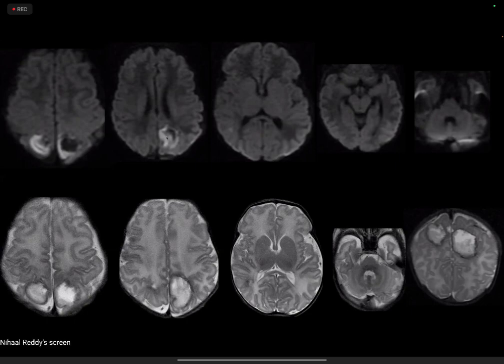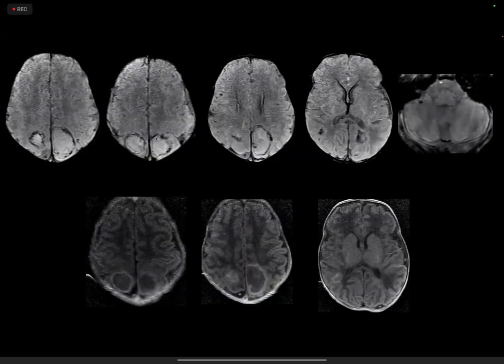Right. And the diffusion restriction is seen in the subacute stage of hematoma, right? I think up to the subacute stage. So again, the diffusion and the blooming, at least the internal portion here is showing restricted diffusion, whereas over here it's only the peripheral aspects which are blooming. So I thought if it's bleeding in the subacute stage, it should be demonstrating some degree of susceptibility artifacts.